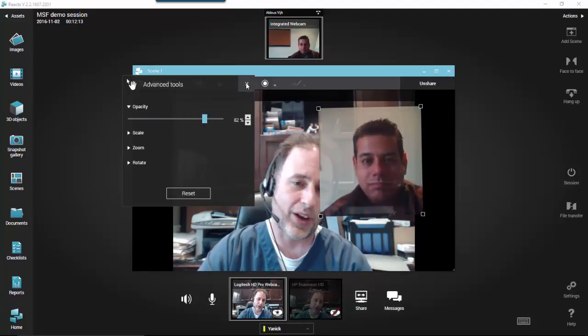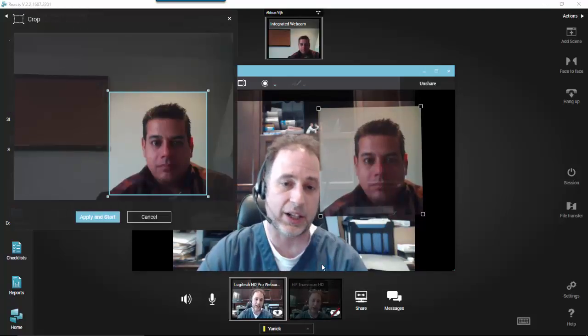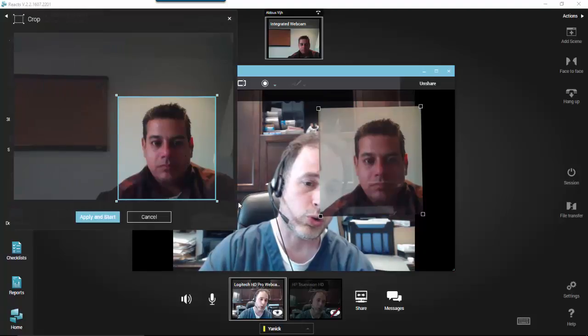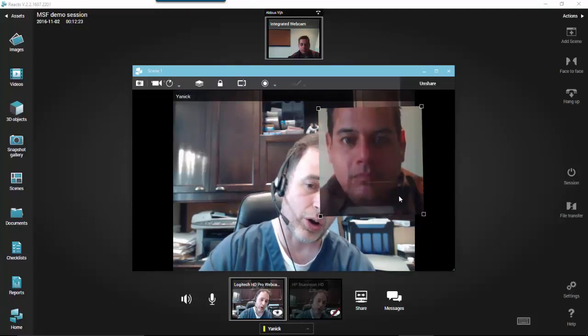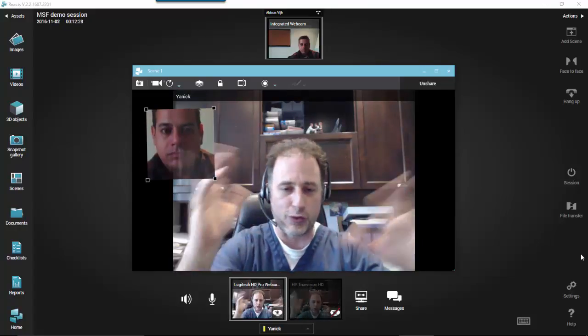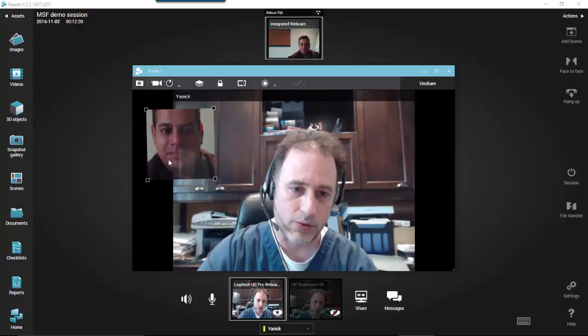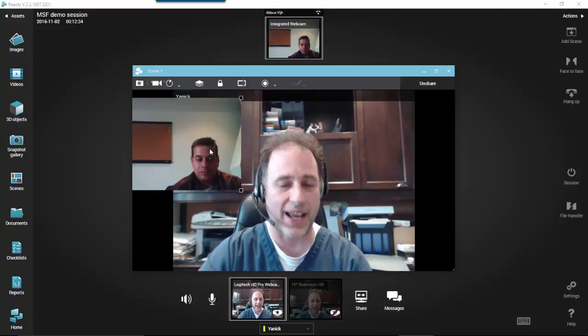So here, if I go back to right-click, there's a function called crop. If I click on it, it allows me to crop this image, zoom and crop where I want. Apply and start. And you see the image is being cropped. And if you're all confused because you did too many changes, you can right-click, choose the option reset, and it just brings it exactly as it was.